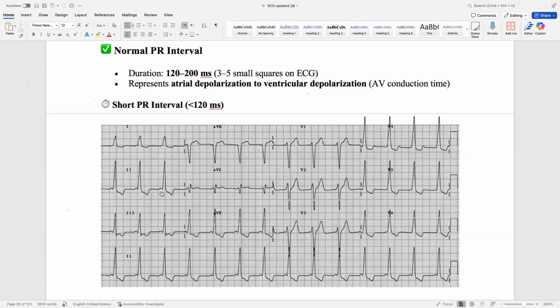What else is there in this patient? What other problem? Inverted P wave? Where? In lead 2. Is this T wave inversion, inverted T wave, or ST segment depression? ST segment depression.